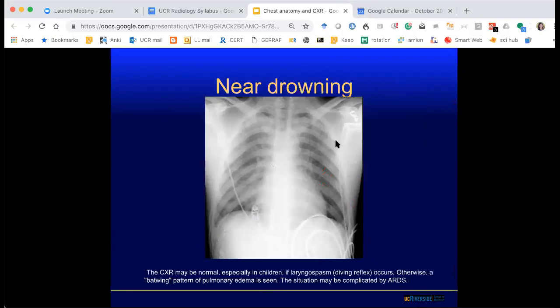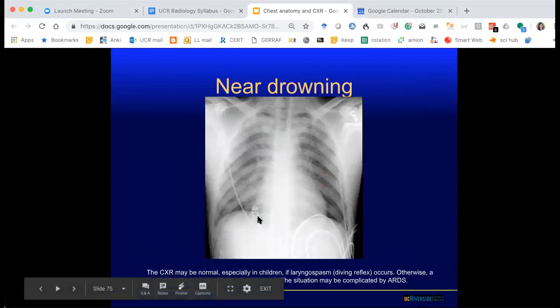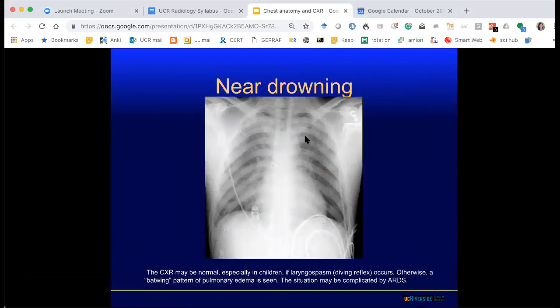Normal lungs, abnormal lungs. They are hyperinflated. I wouldn't say they're hyperinflated because in patients with hyperinflated lungs like COPD, the diaphragm is flattened. And here the diaphragm is normal contour. Decreased volume, so it's hypoinflated, correct. So it's low lung volumes, and then the ribs are closer together, closely spaced, so you know that there's volume loss. And what do you think about the parenchyma of the lung?